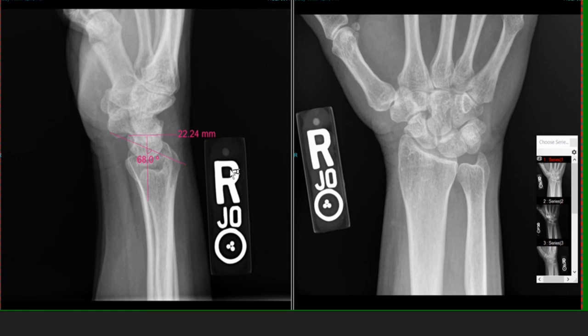And we're coming in at 68 degrees. When I first measured this, it came in at 63.2 degrees. So in both cases, the scapholunate angle exceeds the AMA Guides' normals, which is 30 to 60 degrees. So this is evidence of a mild carpal instability due to scapholunate dissociation. Okay, so we have one finding, which is all the AMA Guides require for a mild carpal instability.